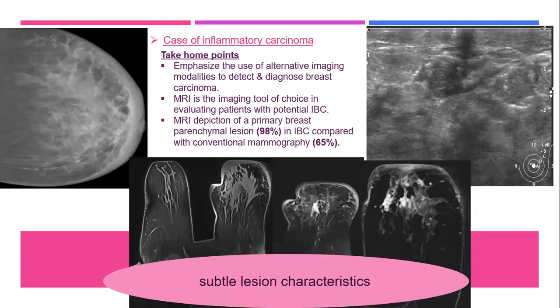Okay, what about this? Abir? For the previous case, I have a question. Actually, I didn't get what you mean. Is it a mass-like or non-mass-like enhancement for this case? Non-mass-like enhancement.